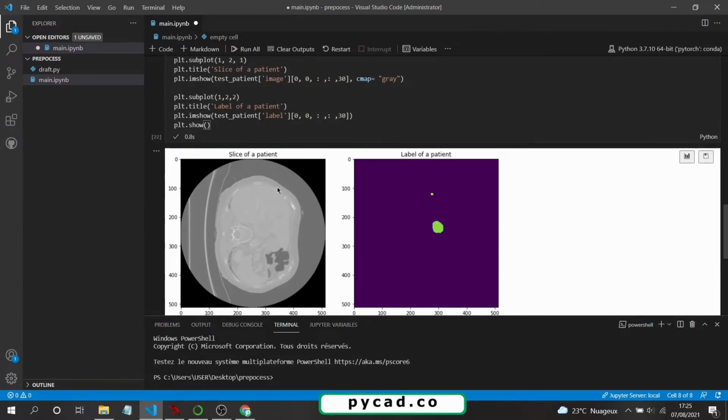The same thing applies when we are doing something like classification of cat and dog. When we have images in the input, we don't just take them and put them into the model. We'll get a problem, of course, so we always need to do a resize in the pre-process.